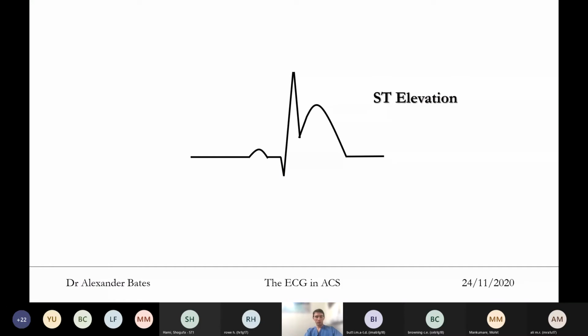Then the bit where your diagnosis just comes out very, very clearly. Your ST segment elevates. So you notice here, it is no longer a QRS complex at all. There's a Q, there's an R, and then the S, well, you don't get an S, you get to the ST segment because repolarization is occurring much earlier, which is an effect that the anoxia has had upon the myocardium, and the ST segment begins.